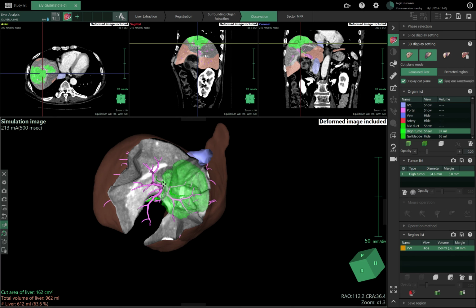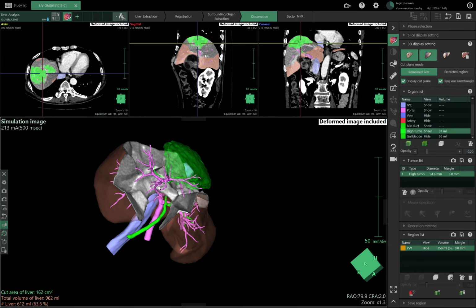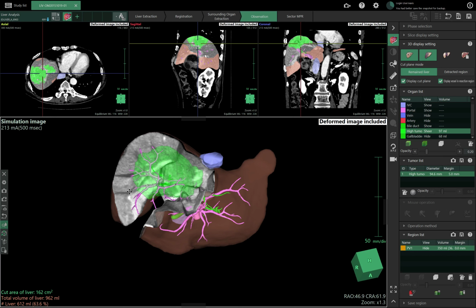In the case of the liver, the segments will be calculated from the portal vein in most cases, and they will need to know from which part would be the region they want to cut, because they want to know what part of the liver is tributary to that exact vein.